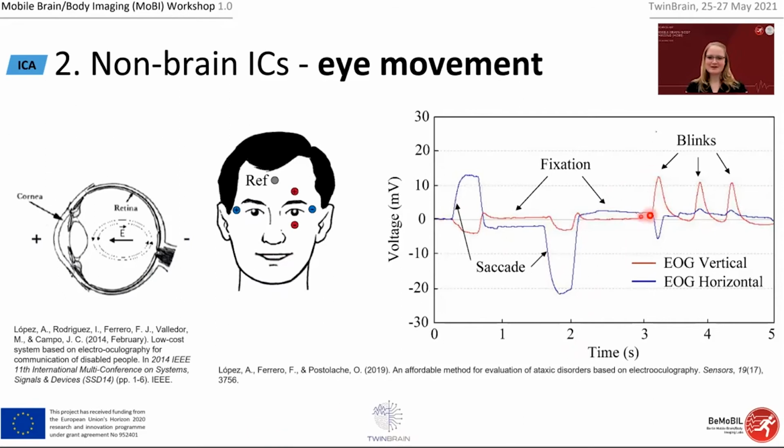Okay, so we have those peaks, these positive peaks in the voltage. And as we have electrodes located on the forehead, as well as the temporal sides, right and left, we kind of collect EOG with our EEG electrodes as well.